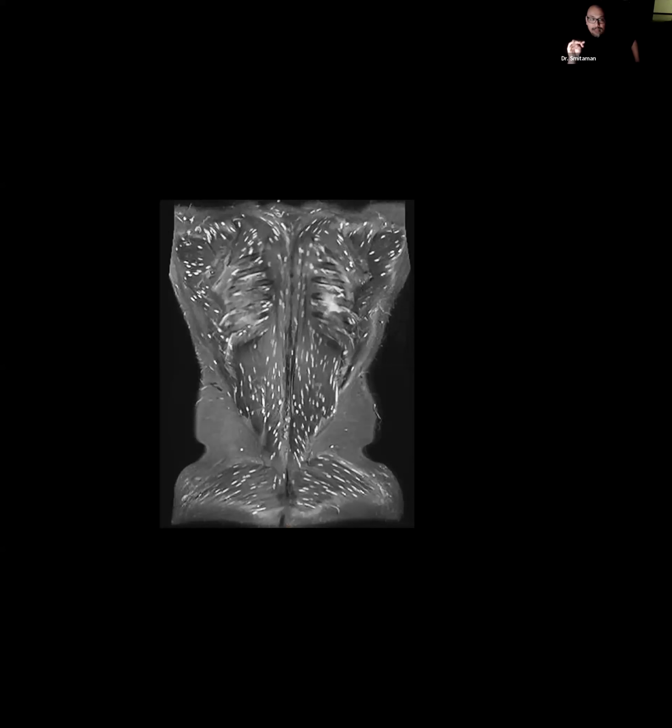But the classic thing that we see in radiology is the last stage, that fourth stage, which is the calcific stage within the brain or on radiographs or CT. And what you see is rice grain, sort of like basmati or long grain rice, longitudinally oriented along muscle fibers.